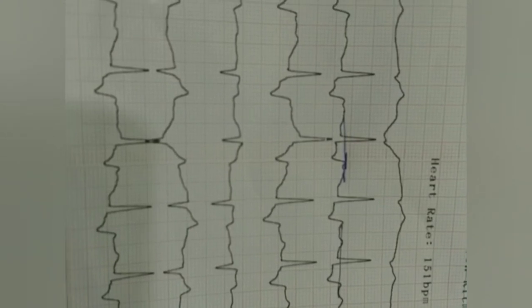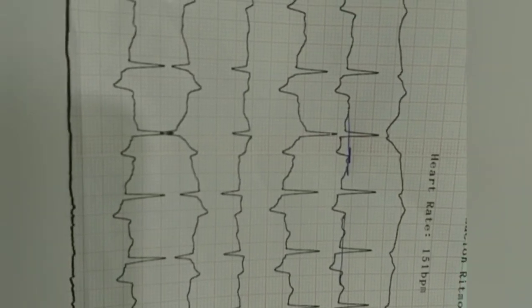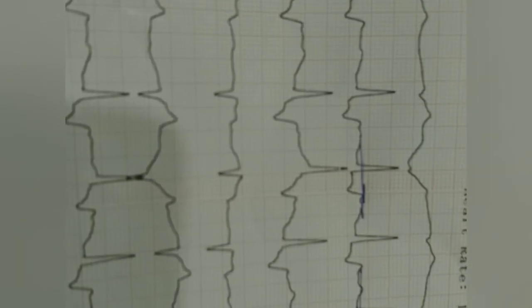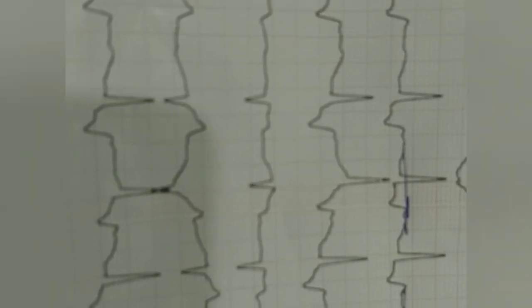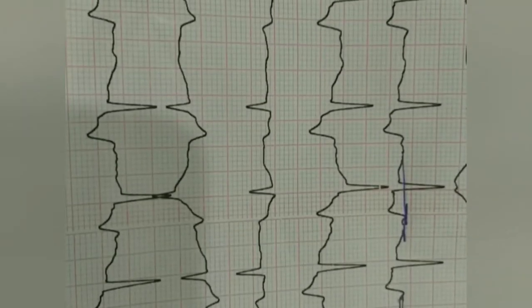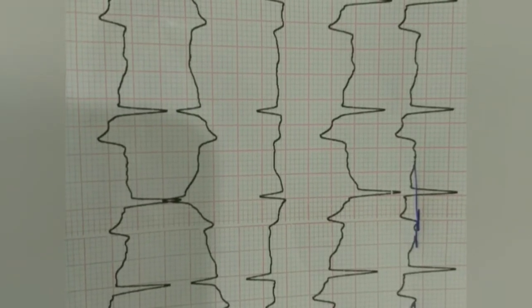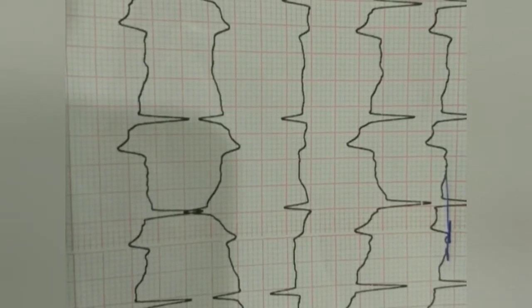But here again the patient had another ECG, and this time you can also see there is very clear ST depression in lead 2, 3 and AVF, and now lead 1 and AVL both are downward, so right axis deviation and broad QRS complexes everywhere, and you can see that there is now a clear ST depression.